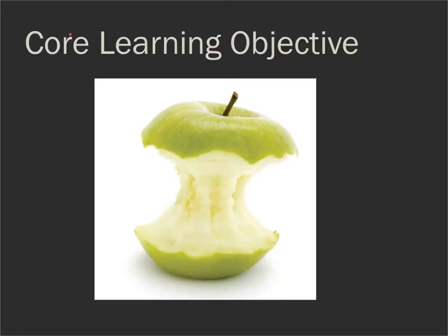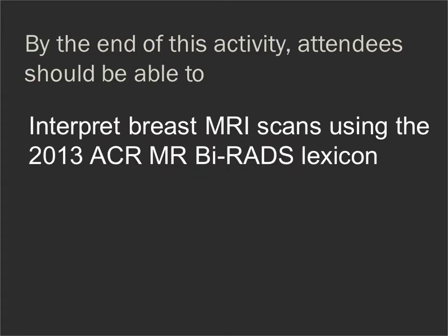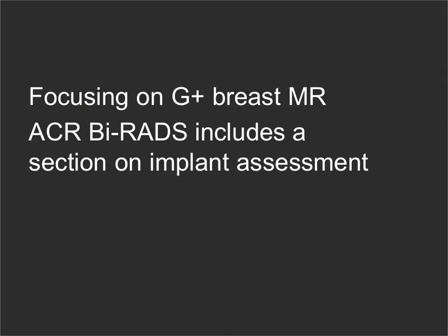The core objective of this short lecture is for you to be able to learn how to interpret breast MRI scans using the 2013 ACR BI-RADS lexicon. In this talk, I'm going to be focusing on gadolinium enhanced breast MRI, although just note that the ACR BI-RADS does include a section on implant assessment.